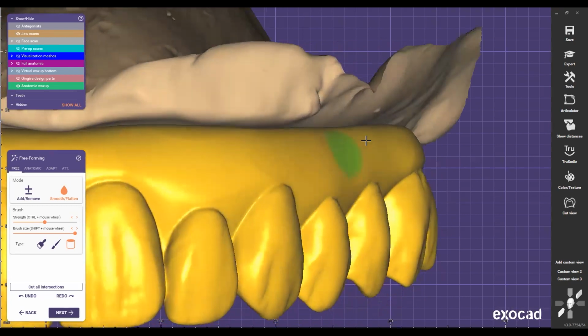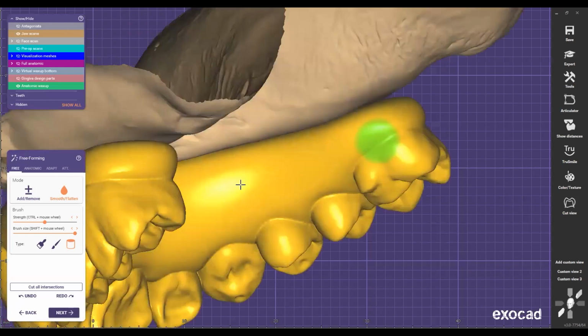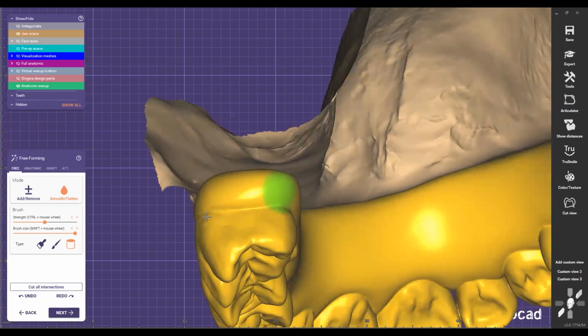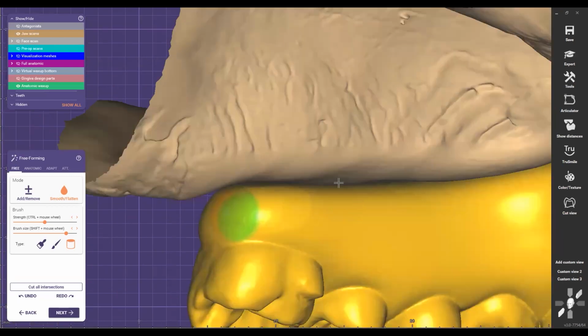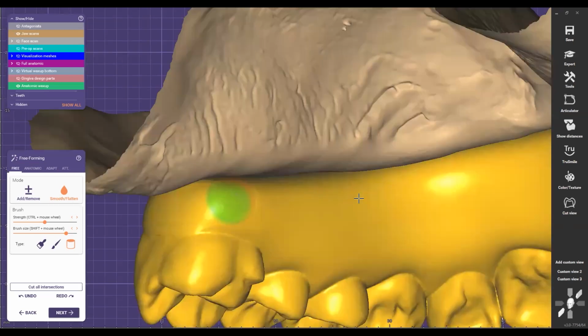So it's gonna be cleansable, right? Right there, especially right here. I don't wanna leave that there. And I see it from profile, and I wanna get rid of that, because this needs to be a cleansable surface. So, and then I do the same thing on the lingual.